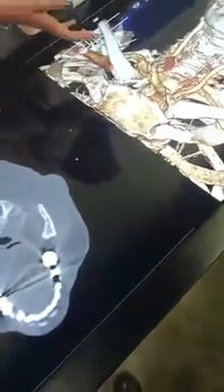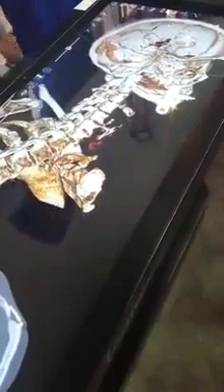So here we have a post-operative scan of a patient with a brain aneurysm, and this is the actual CT that was provided. You can go ahead and slide through the CT and see exactly where the clips were placed as well. So if I go down here, it'll show where it is here. And same functionality as before. You can go ahead and make a quick cut into the 3D model and see where the clips were placed as well. So it's kind of more intuitive when you see something in 3D, where the clips were placed rather than just focusing on a CT.